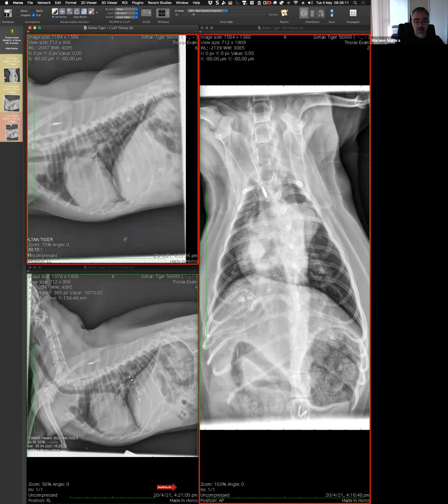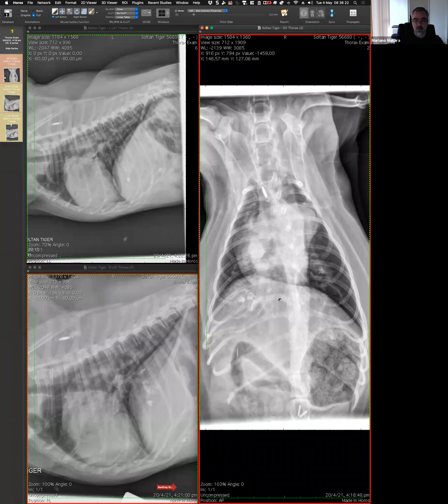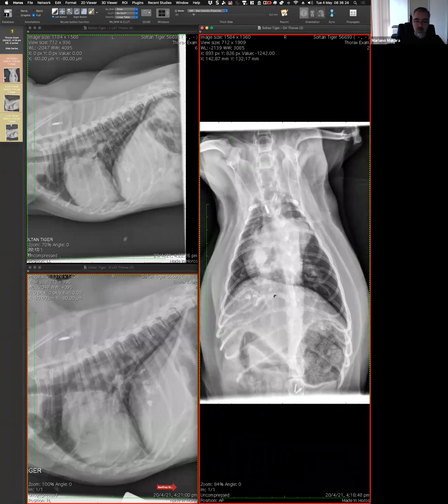So things are falling in place. I think this is another tortuous pulmonary artery. I'm certain this is a large pulmonary artery. This is also a pulmonary artery, and this is as well. I like your comments about the mineralization and putting that together with a granuloma. And I don't know how many of the heartworm cases go with mineralization, but they do go with abnormal lung and granulomas. So then there's another thing that you put into that bag. You're collecting evidence for your hypothesis to defend your hypothesis.